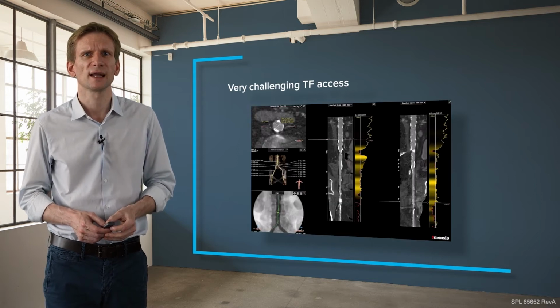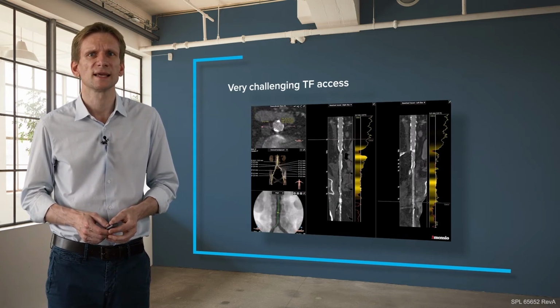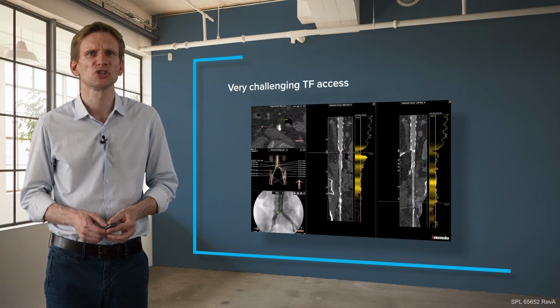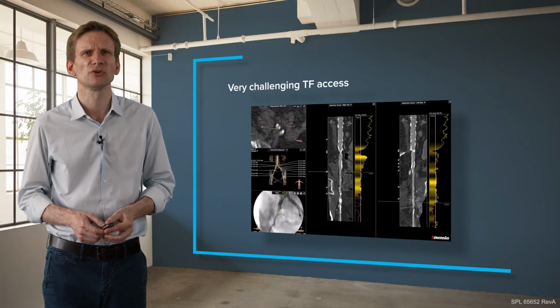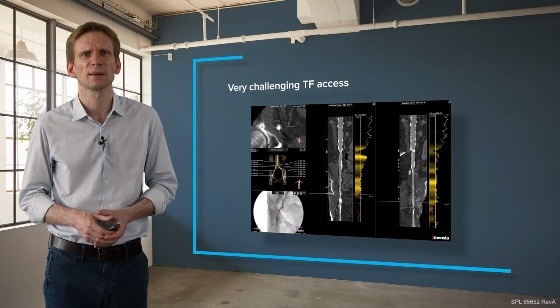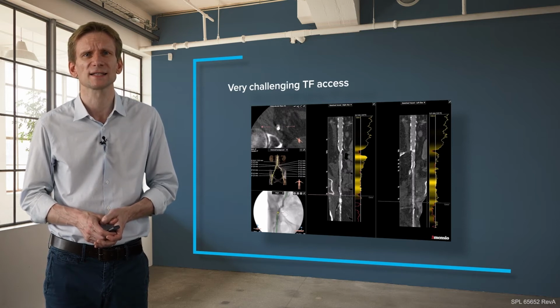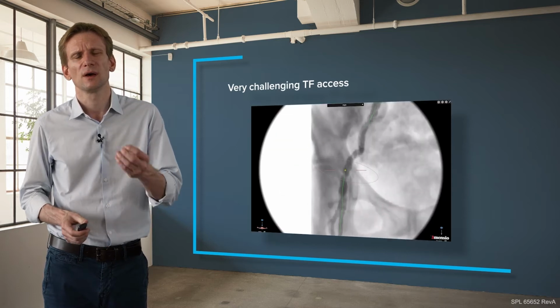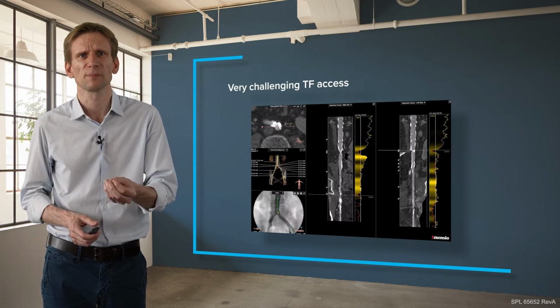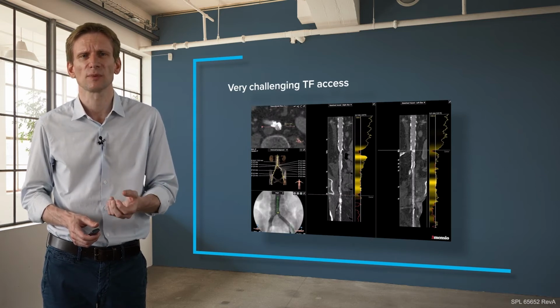Here again, CT analysis. We analyze the entire, first we start at the aortic level. This is the iliac bifurcation. You see a lot of calcification there. On the right-hand side, you see that the luminal diameter becomes extremely small. So probably too small to my understanding, but especially what is a problem here is also the access side, because you know you have to close this access again at the end. So if you have a calcification and a very small lumen just above your anticipated puncture site or access site, this is probably also not very favorable.